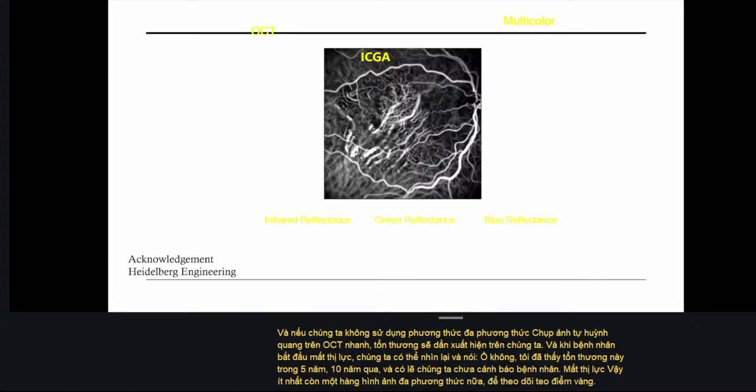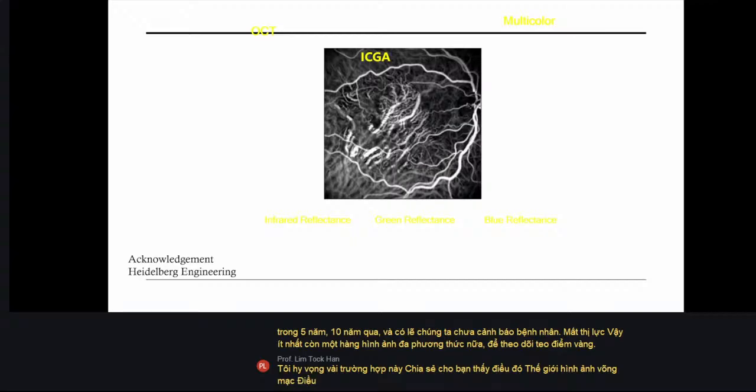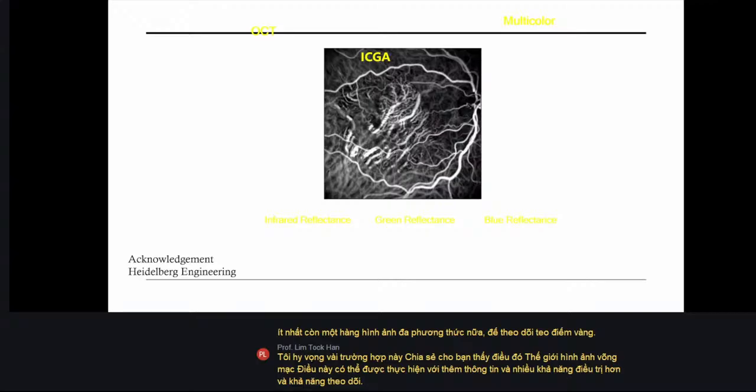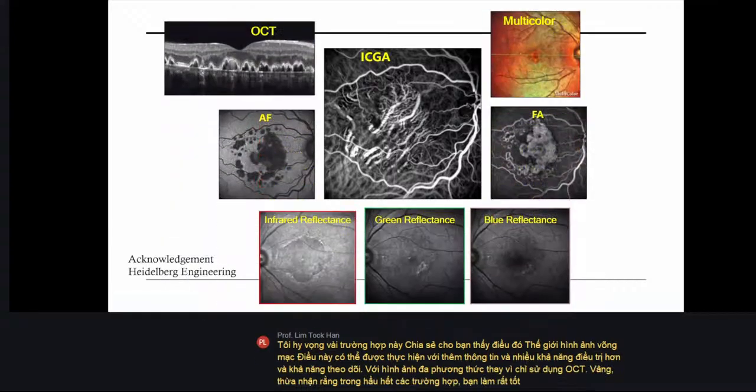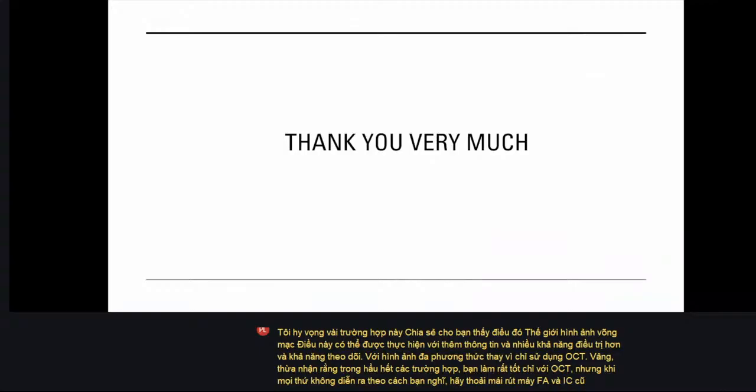And I hope these few cases show you that the retinal imaging world can be accomplished with more information, more treatment possibilities and monitoring possibilities with multimodal imaging, rather than just using OCT alone. Granted that in most cases you do very well with just OCT, but when things don't turn out the way you think, feel free to pull out your old FA machine and ICG machine. So thank you very much.